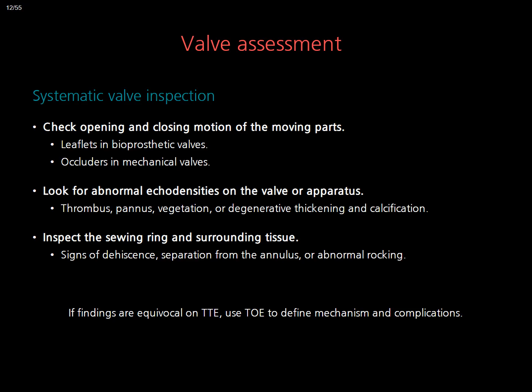Then focus on the sewing ring and its attachment to the annulus. Any separation or abnormal rocking should raise concern for dehiscence and possible paravalvular leak. If TTE is limited by artifact, TOE is often the fastest way to confirm the mechanism.